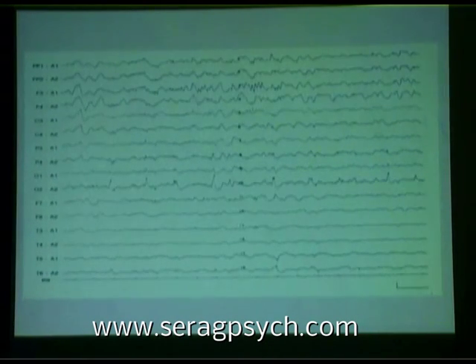Next, please. And you can see it again on a referential montage to the right ear. By the way, how do you check to see whether the reference is good or not? How do you know that this comes from O2 and not from A2? Well, what you do is you check some place that's way far away from O2.